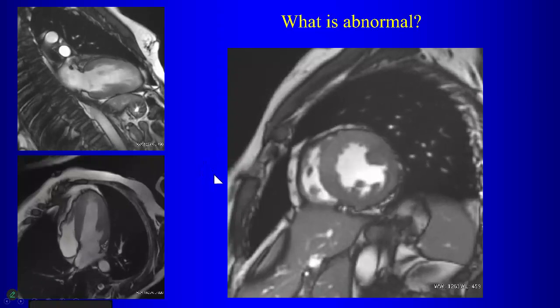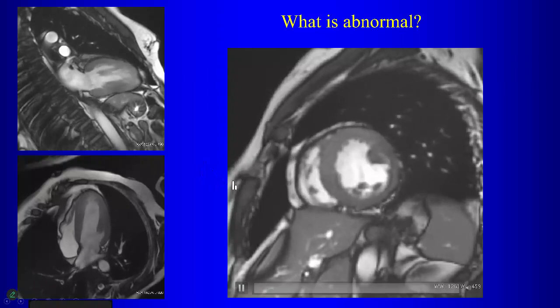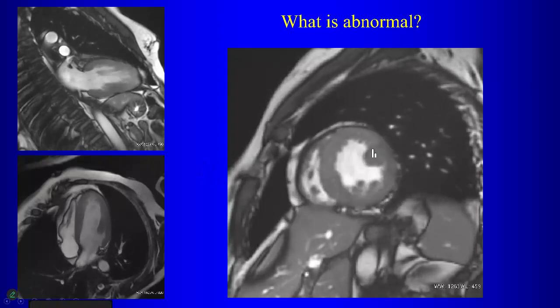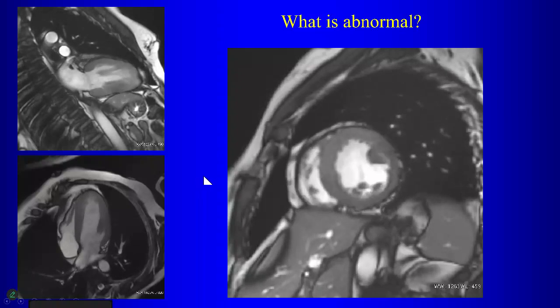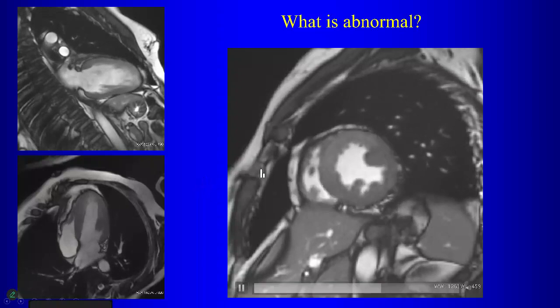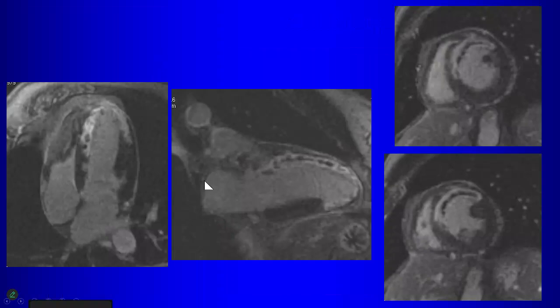So here you want to look at delayed enhancement because what are you looking for? You're looking for infarction, right? Because at rest, this person has a defect. Now, hibernating myocardium can also do that, right? Can also give you a wall motion defect. So that is another consideration where the stress study might be important. But here's your delayed enhancement. What does this show?